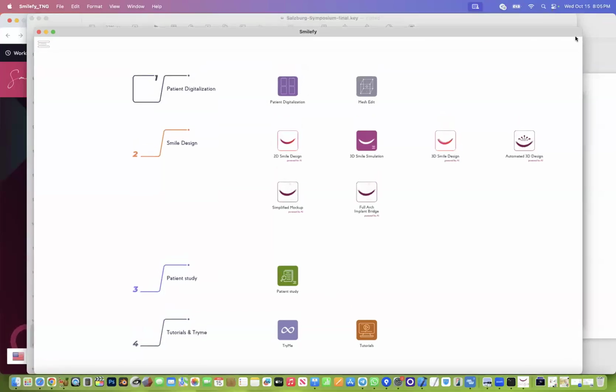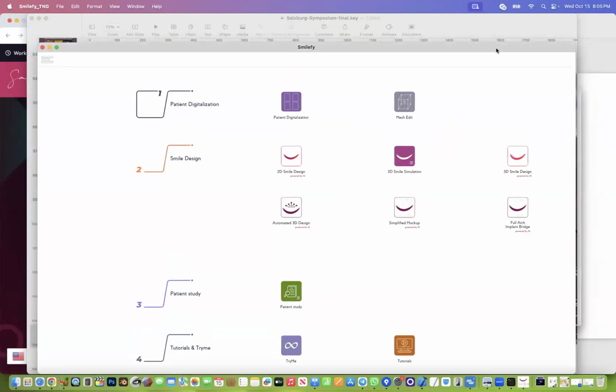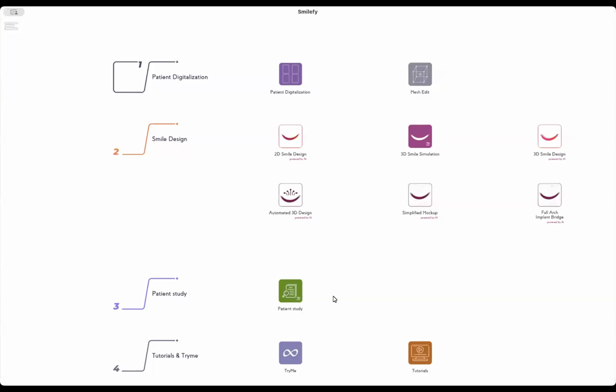So the idea with everything that we do is to be able to have a tool to analyze the patient's face using AI, automatic facial analysis, and so on, offer the patient a quick smile simulation to motivate the patient for an aesthetic treatment, and then to have a tool to create a 3D smile that we can print, we can create a blueprint for the result of the new smile, including comprehensive treatment plans, including ortho, including airways, everything automated and everything in one tool.